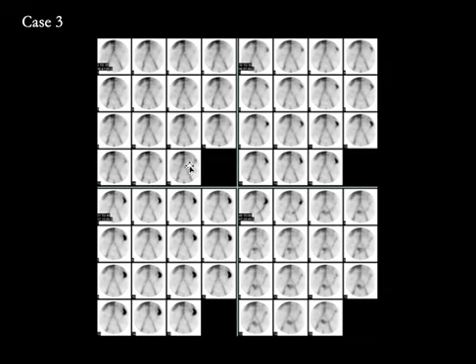Another positive bleeding scan. Here, as we go through the images, we find that the abnormal focus again appears here in the left upper quadrant in the region of the splenic flexure of colon, and as we follow this focus, we find that the activity goes more antegrade in the pattern of the descending colon, which is best seen here, and then into the sigmoid colon. Towards the end, we see some physiologic urinary bladder activity as well.